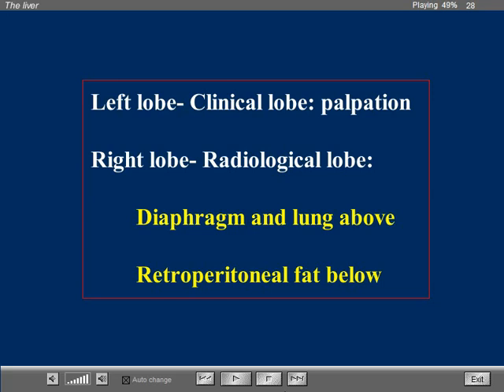The inferior portion of the right lobe of the liver has a fat interface between the liver and the kidney, and the retroperitoneal fat that covers the outline of the kidney and the visceral surface of the liver allows one to see the hepatic angle, which is also depicted by the fat of the right flank.